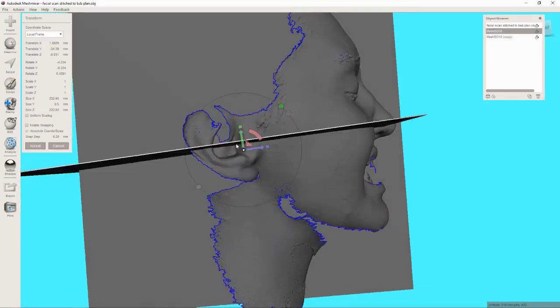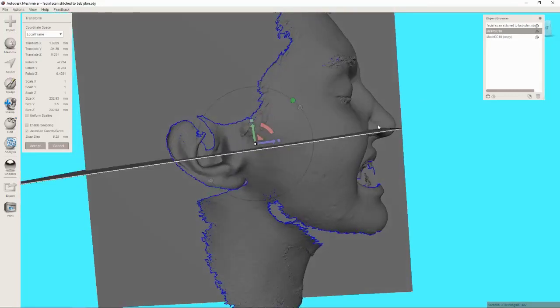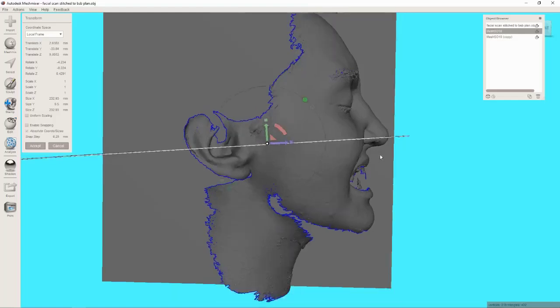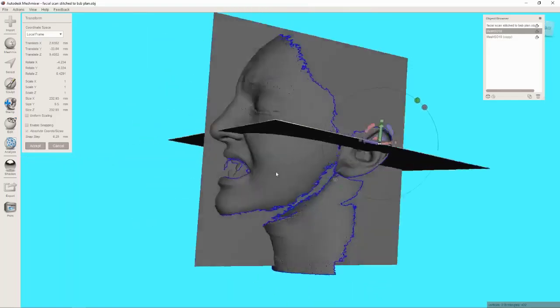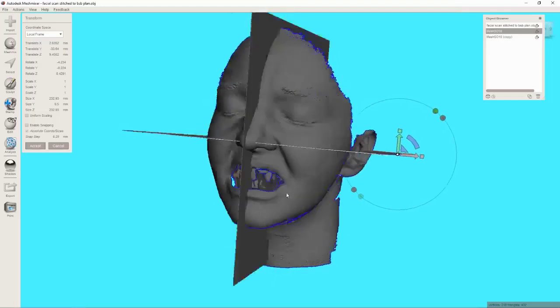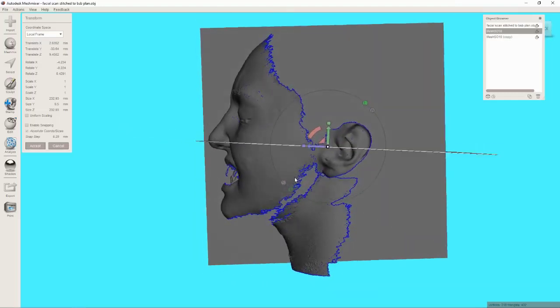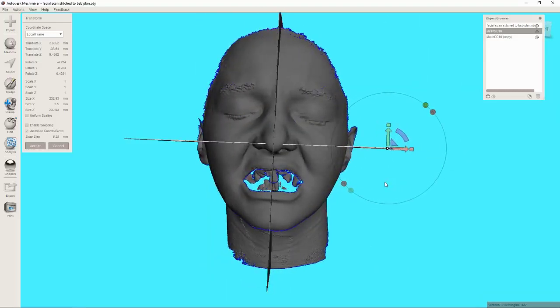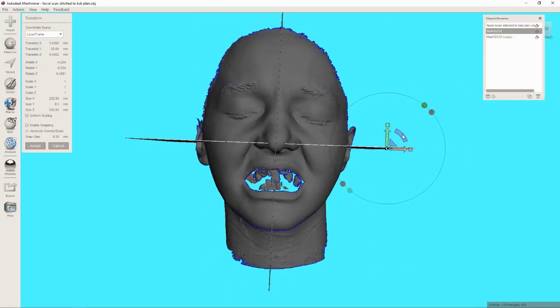Alright, tragus of the ear right on the tip of it to the ala of the nose. Alright, that is now my, that's going to be parallel to the occlusal plane. Okay, parallel to the pupils here, parallel to ala-tragus here. And that should be symmetric side to side as well. If it's not, tweak it.